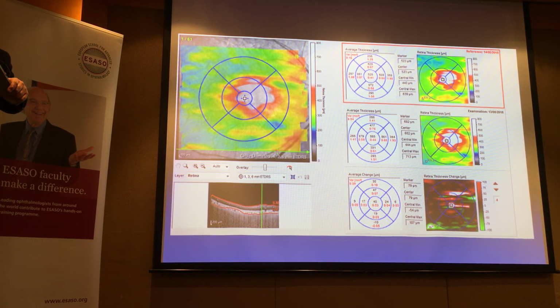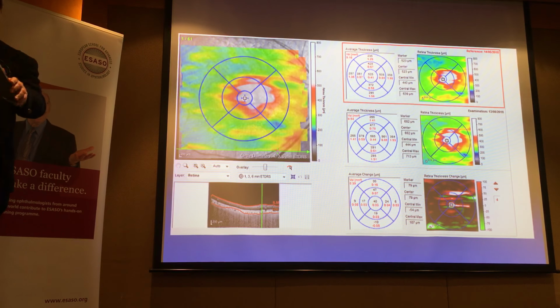So that can be an indication, and in fact, that was the practice, especially during time-domain days, possibly because we didn't understand enough, and very likely because in those days, at least in my department, we just had one printout with one slice, one section, so that's all we had to go on. So of course, we had to rely on this, but this doesn't entirely tell the whole picture.